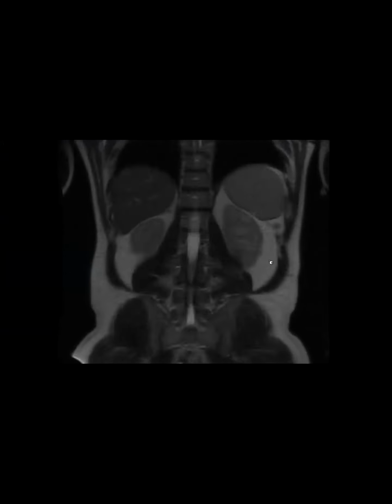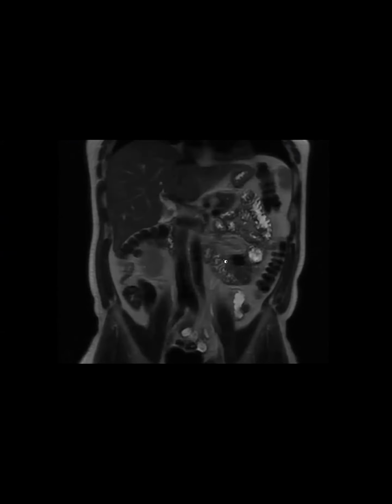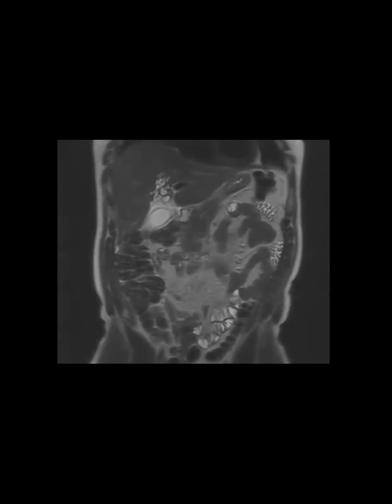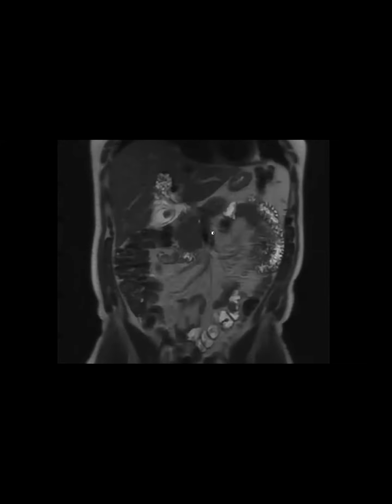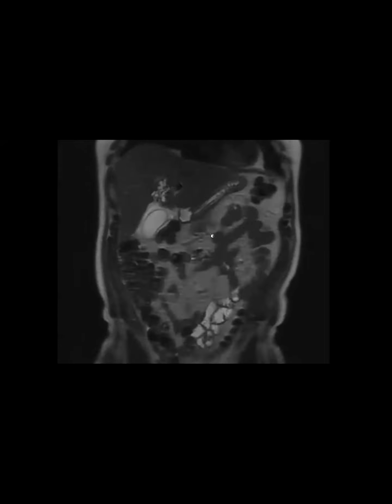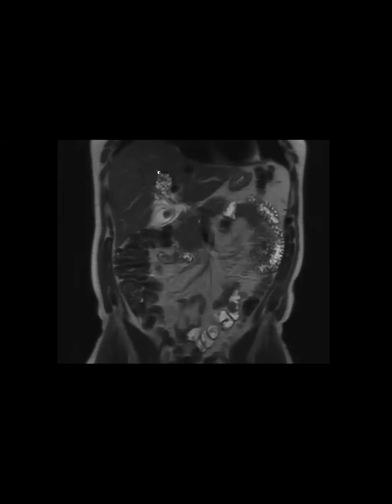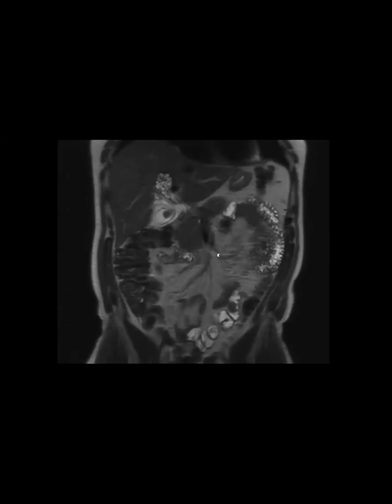All the peribiliary cysts we've seen, Aarti, are lined up along the bile ducts, and patients usually have some kind of chronic liver disease also. I know. That's what the path said. Yeah, I agree. They did a localized resection. It was a benign finding, and we do have a post-op EOVist, and there's no issues with the biliary tree, but it was very interesting.